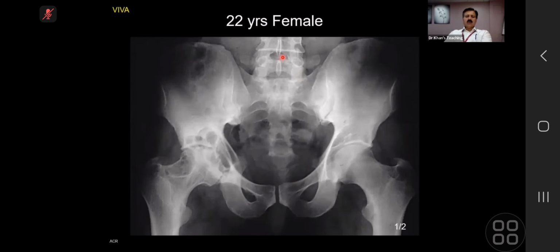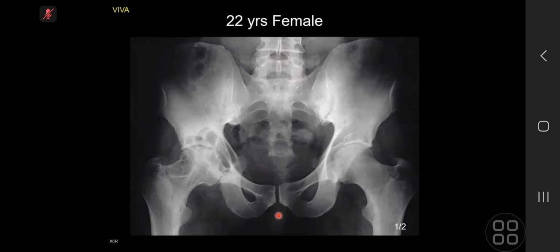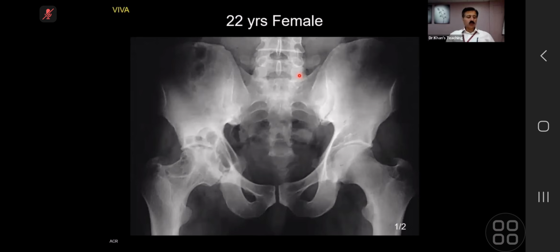Sorry for that. Now, this is an extremely good exam case. So concentrate on this. This is closer to 9, but please concentrate. Very, very good exam case. Over to you. Okay, so this is a frontal pelvic radiograph of a 22-year-old female. I can see the abnormality is centered over the right femoroacetabular joint with multiple punched out lytic lesions, some of them showing a sclerotic margin on both sides of the joint. I can see. Excellent. What is your conclusion?